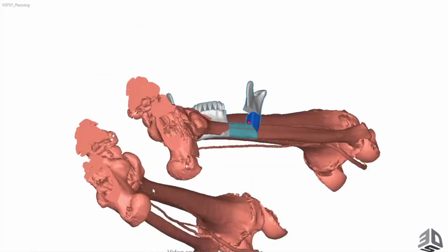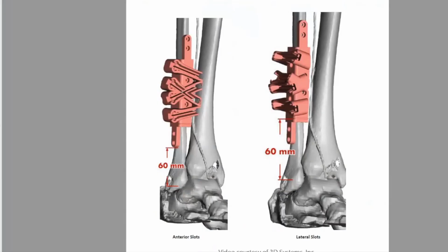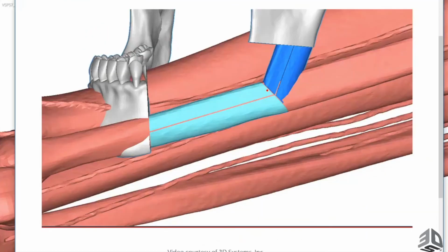Yeah. So reorienting us just to make sure that we're looking from the lateral surface. Let's see. Yeah, I'm happy with the lateral surface. Okay, perfect. So what that would be then is we would see those cutting slots, making sure to make those osteotomies here, here, and here.